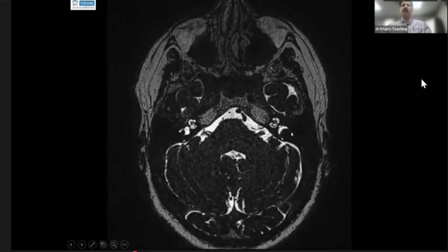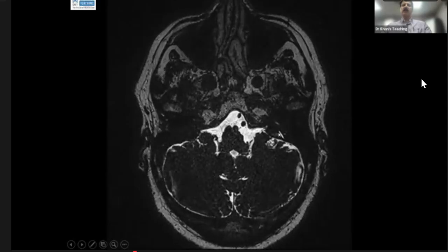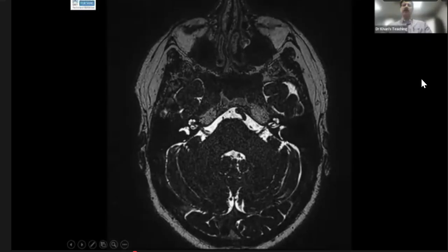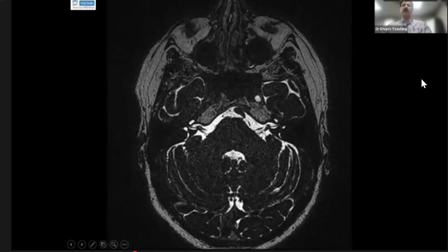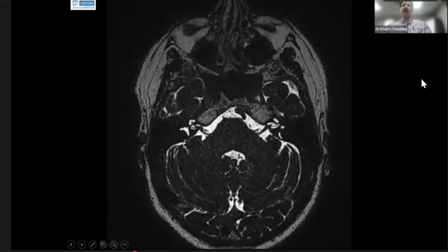You see, it will make a circle like this. And something which makes a circle superiorly will be the superior semicircular canal, and this one is the posterior semicircular canal. Let's go to our friend, the facial nerve. And you can see there is a thinner nerve than this one here. And you can see that the cochlea, this is the cochlea, is going superior.